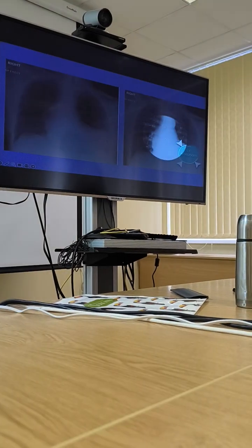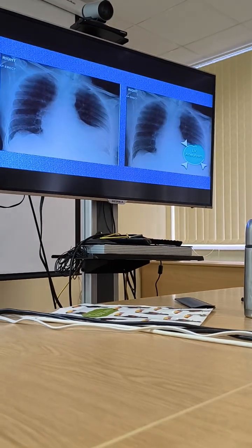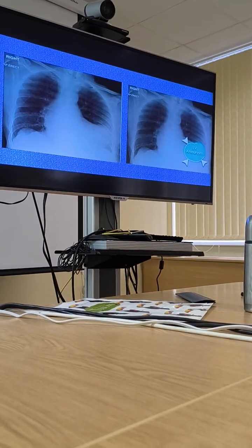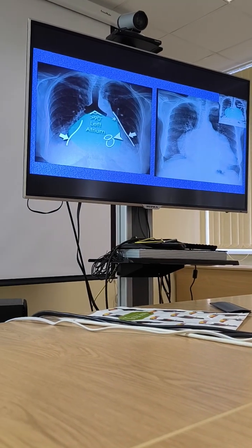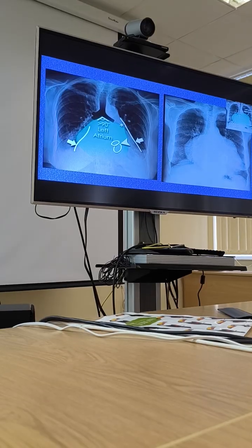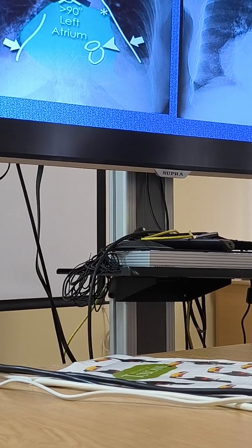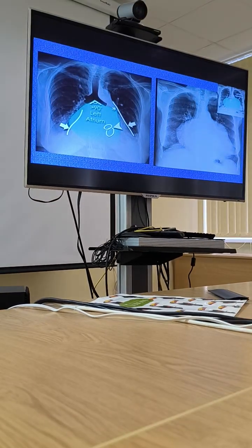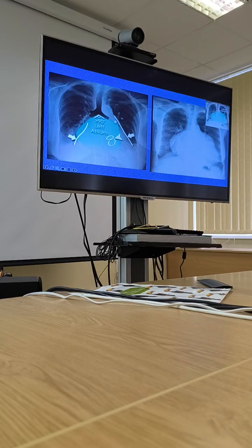And then we'll see a heart in the shape of a duck. Does it look like a duck? Like a toy duck. So this is how it looks. We don't see it often right now, but with a severe mitral valve abnormality, we can see a mitral shape of the heart, and it looks like this. A big left atrium turns the heart into such a special shape.